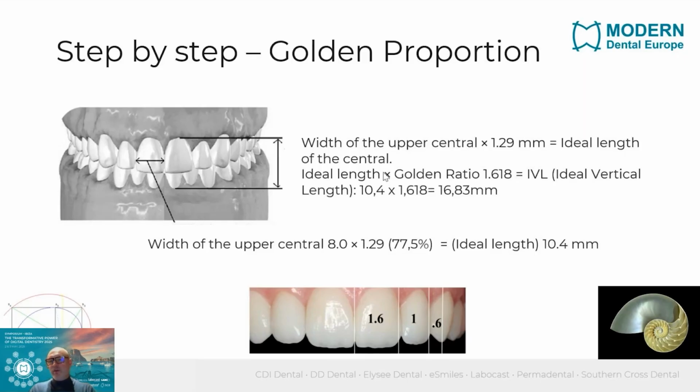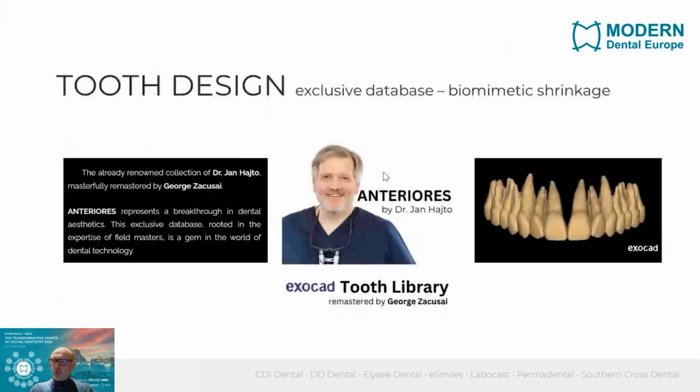So this is with, of course, also the overbite of 2 millimeters included. So this is quite normal. Normally we have about 18 millimeters. So these are proportions, measurements, and let's say calculations we can do to come to what we call the ideal smile design.